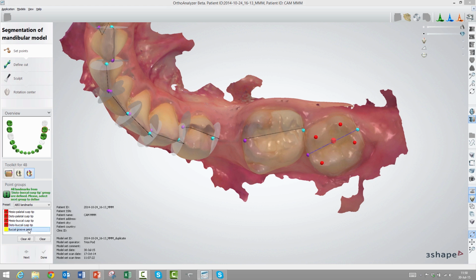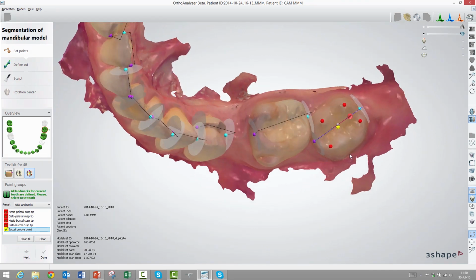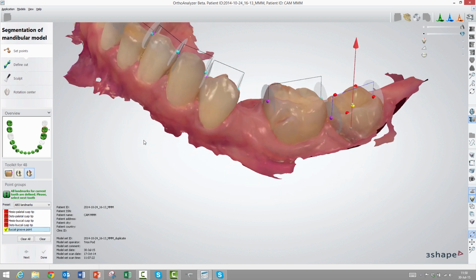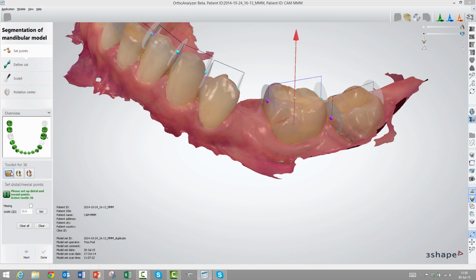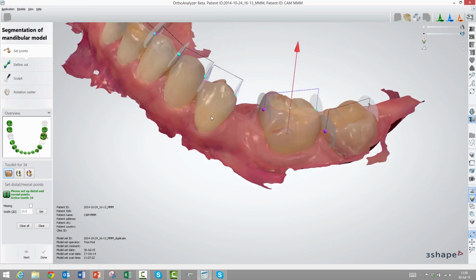And the last one in the buccal groove. So now I have some extras. Yeah, and you can use them for ABO analysis, etc., later on. Exactly. So I'll just go between each, and I can use the keyboard arrows to jump between each tooth. Here. So if I need to check quickly between the teeth, I'll just jump between the teeth.